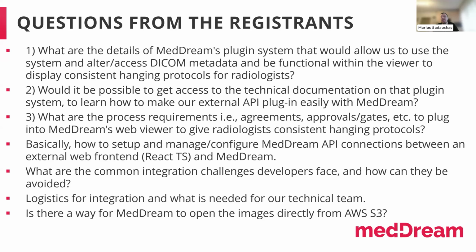So if you would like, it is possible to set the wanted layout, set each series displayed in your desired viewport. So you can either use our hanging protocols, or you can use the communication API and put instances in the viewports how you want and how you like it.